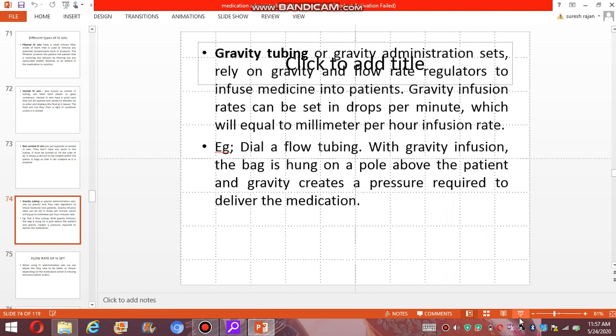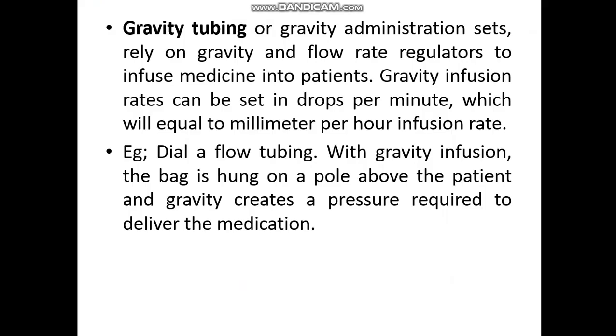Dear students, we can continue with our IV infusion sets. Next we can see the gravity tubing. Gravity tubing mainly depends upon gravity and also on flow rate regulators.